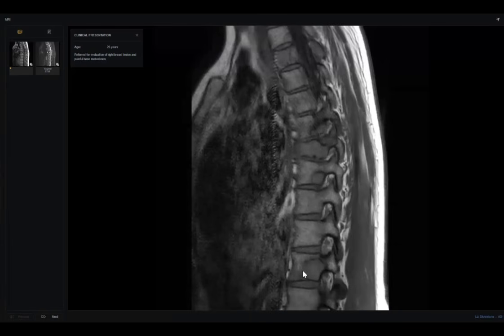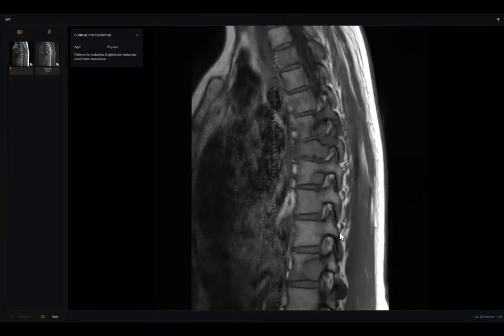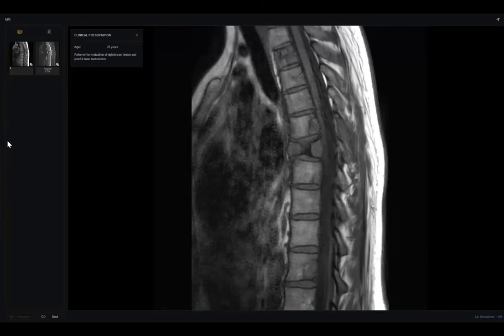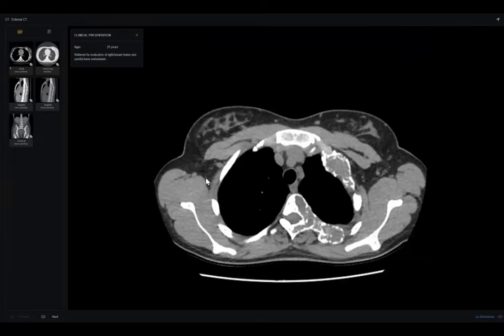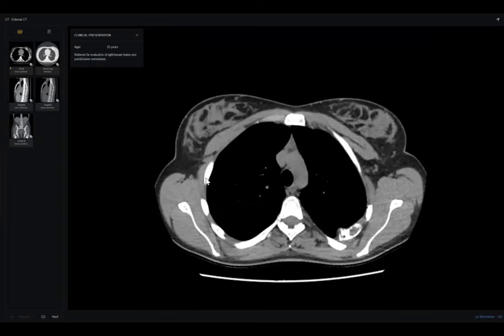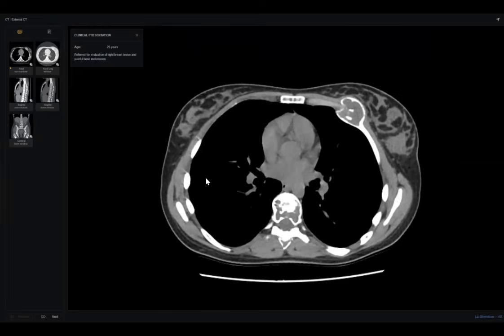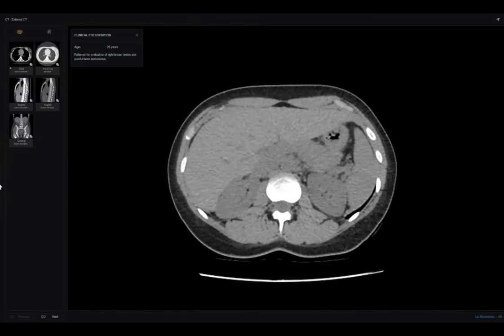Despite there are sclerotic rims, there is no extra osseous extension, no destruction, but in practice, most of us will ask about the past history, about X-ray. So again and again, it is allowed for you, when you are confused with something, to ask about primary examinations like X-rays. It is very helpful.